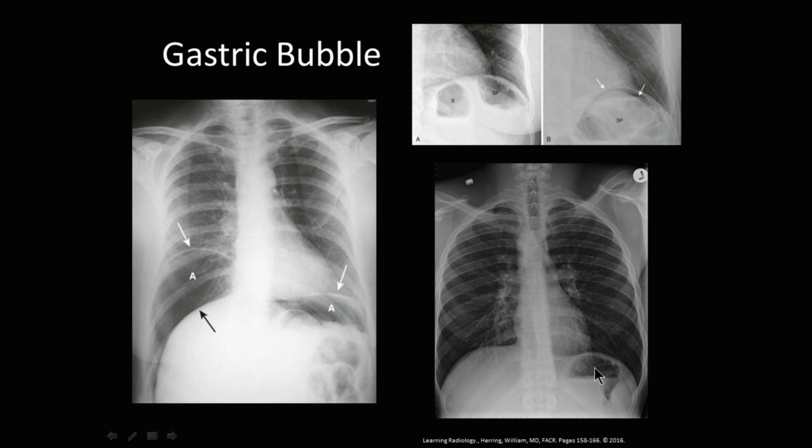But sometimes you have free air within the abdomen. We'll talk a little bit more of that, but here are some examples where you have normal, and then this would be abnormal. A little bit of air above the splenic flexure, or here bilaterally you have some air underneath the hemidiaphragms.